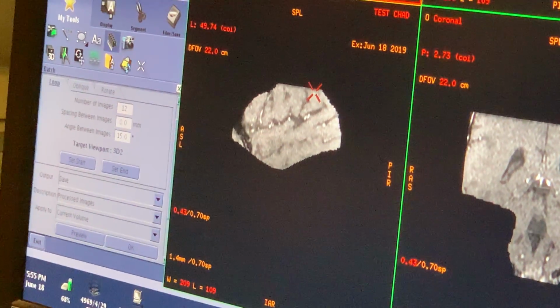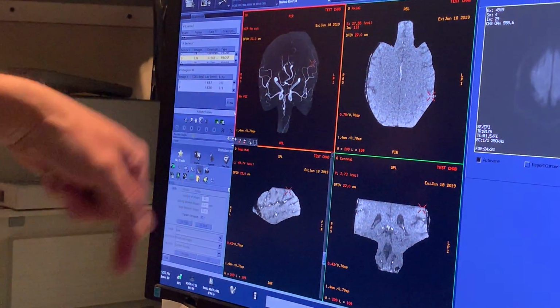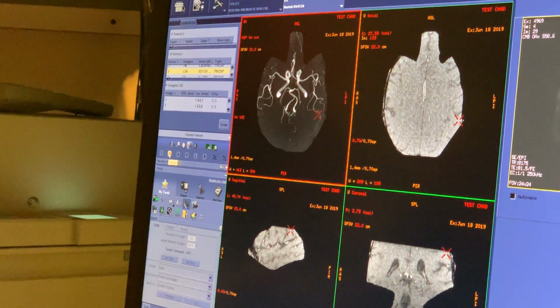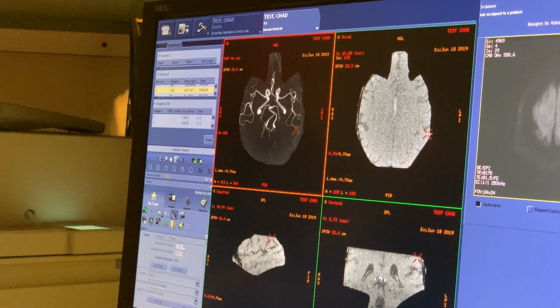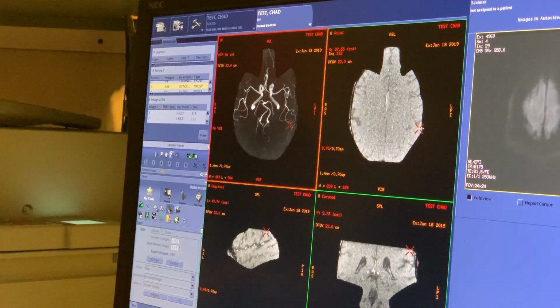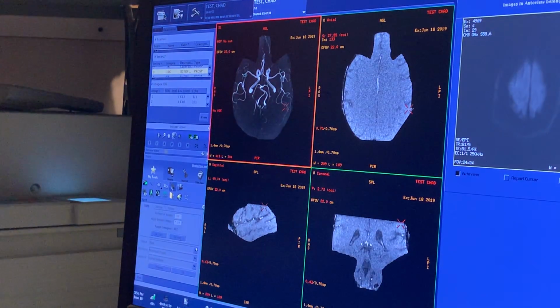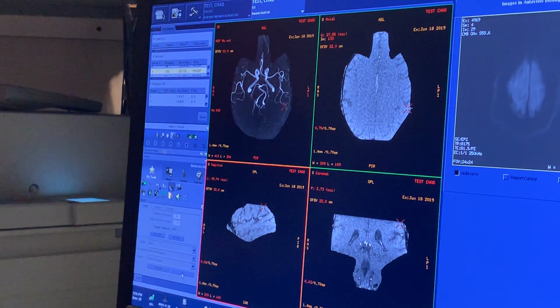So I'm going to start with the brain rotated so that the nose is pointed down. I'm going to hit start. I'm going to go to I, which means the nose is pointed up, and then I hit end. And you get to choose the number of images that you want. I choose 36, which means it gives you one image about every 5 degrees or so. All right? So that's pretty much that. And then all you have to do is click OK, and it'll do it.